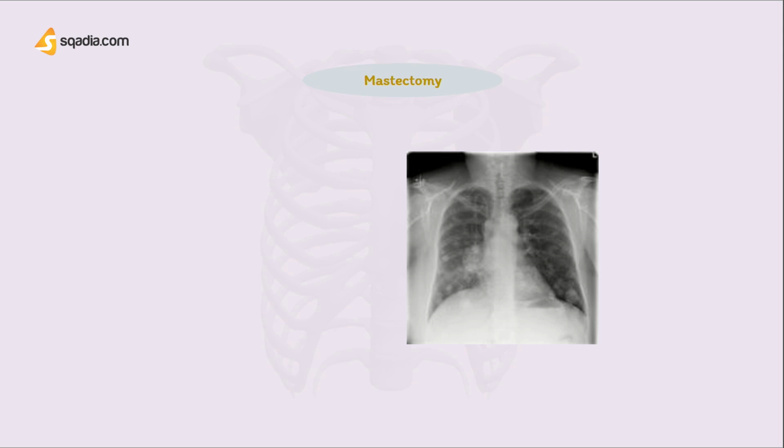Now we move on to mastectomy. Now, it is important to remember that problems outside the lung can sometimes cause the lung fields to look too black or too white.